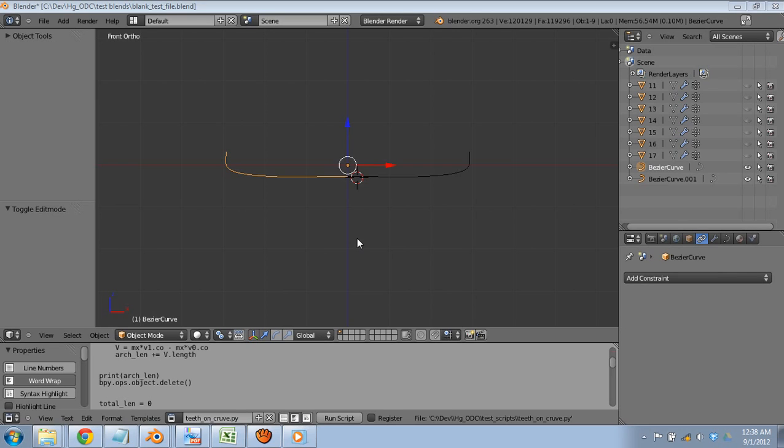Alright, I want to demonstrate some of the new stuff I've been working on. I haven't had a whole lot of time to work lately, but this has been brewing in the back of my mind for a while. Actually, it was some of the first stuff I worked on, but I got so frustrated with it. I didn't know enough about dentistry or enough about Blender to make it happen. But things have progressed both in my education and in what Blender's capable of, and now it's actually pretty easy to do what I'm about to show you.